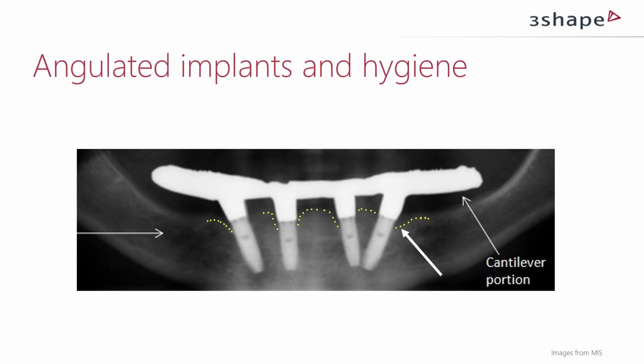So we have now seen several considerations you should think about when planning for implants, when placing implants. These considerations are the same for freehand placing or for planning with Implant Studio. So there is no difference.